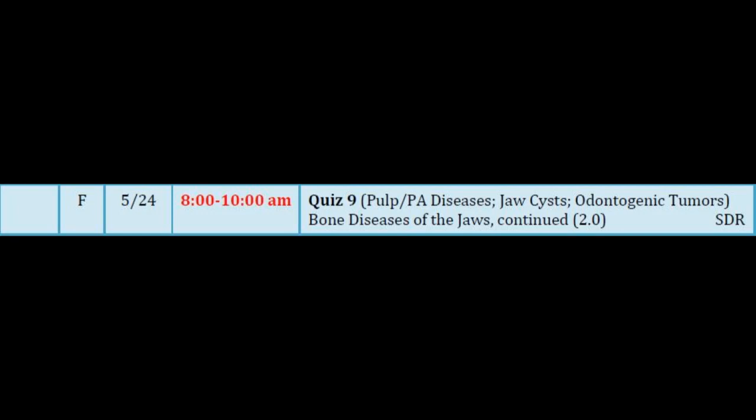That's when I think it's fair game that you would have a suspicion that that's a bone-forming malignancy. It's ill-defined, has a vague edge to it. This patient is complaining of drifting teeth, tooth mobility, pain. You put it all together, hopefully you would have a suspicion of osteosarcoma. Is it an easy diagnosis? No, it's a really hard one. So these sometimes get missed.